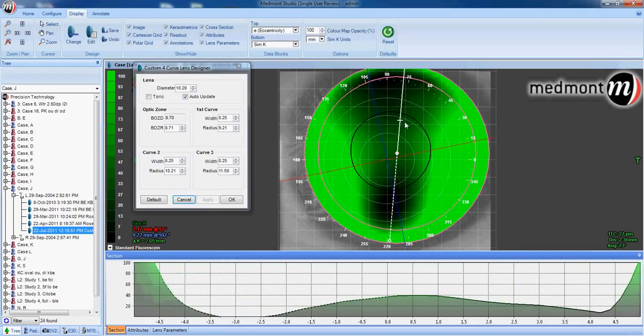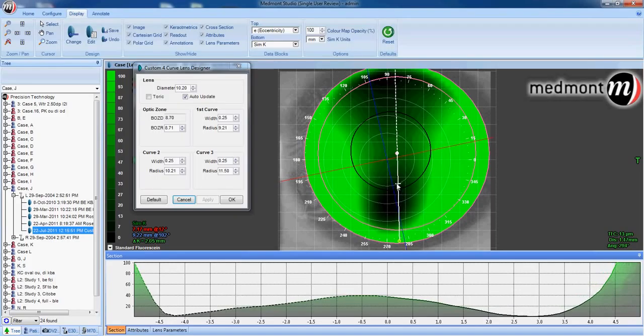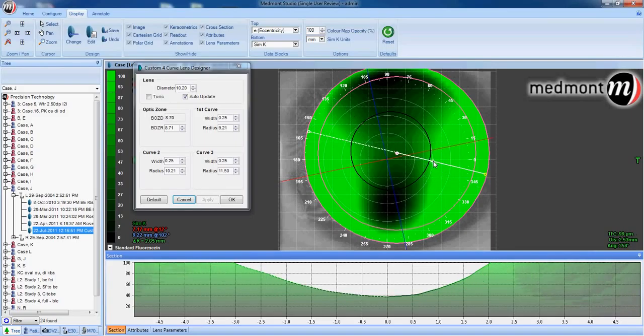So observing the graph down below, which axis does the lens appear to land at on two opposing sides? In this case, at 12 o'clock, dotted section of the line here, corresponding dotted here. And at 6 o'clock, solid section of the line corresponding here. So 0 would be the corneal surface. We can see our contact lens lands at this point, then up to apical clearance, lands at this point. Then, which axis has our highest lift?